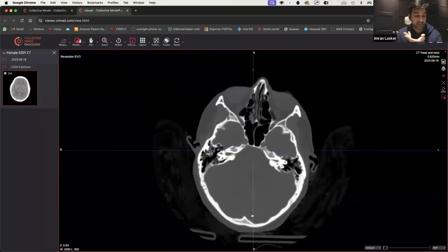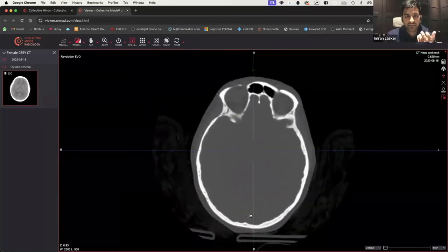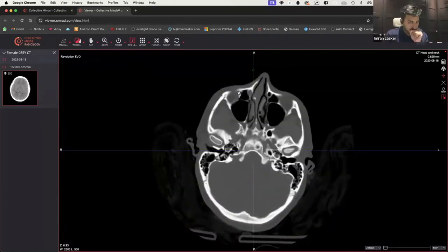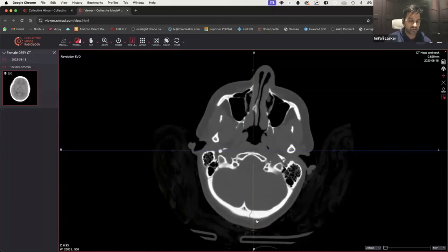So at first glance, you may think that, oh, it's not a fracture, it's just a suture. But actually, what's happened is that we thought the impaction was probably somewhere around the frontal lobe because of acceleration, deceleration. But if you've got a fracture in the occipital, what's probably happened is that you've got an injury in the posterior aspect, and then you've got a contra injury. So contra injury is when you've got an injury on the opposite side.